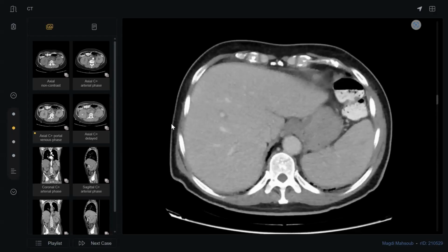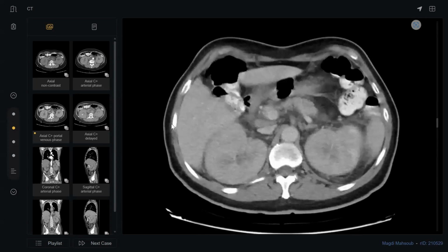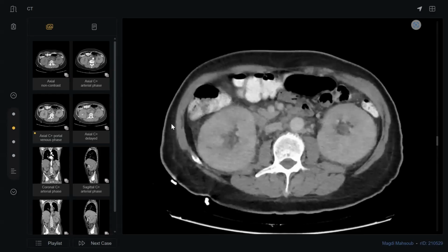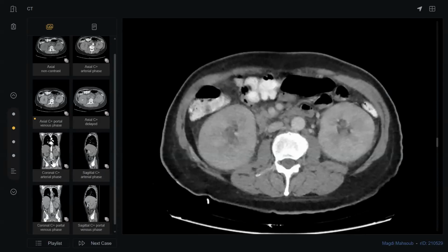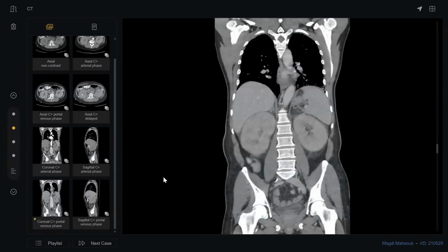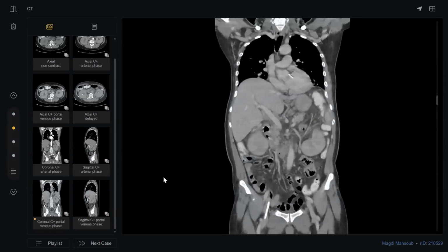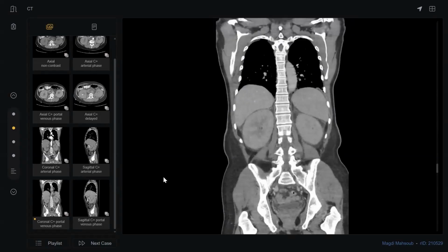So that can be a case of infection leading to enlarged kidneys, and one more thing, lymphoma can be, but there is significant fat stranding on both kidneys, so lymphoma is less likely. Why, doctor? Why? Do you think infection will cause this bilateral, nearly symmetrical enlargement?